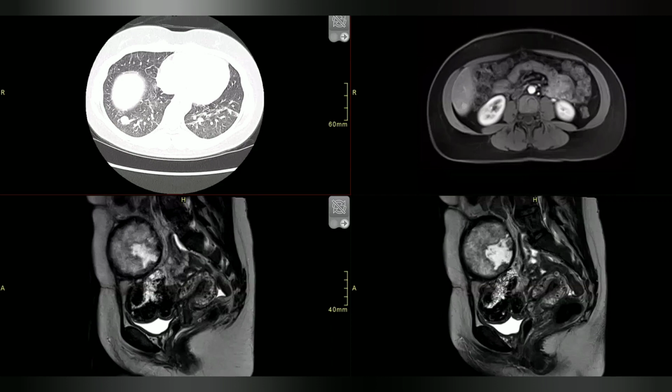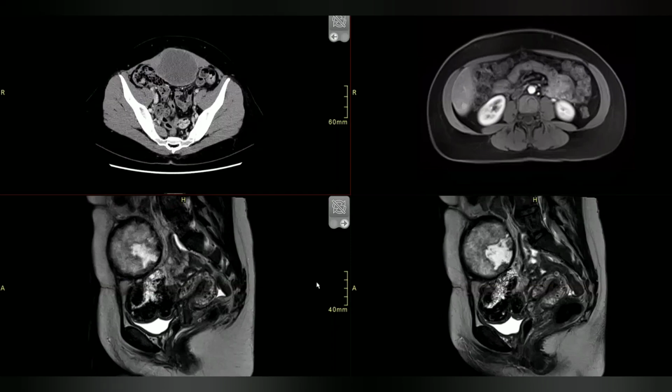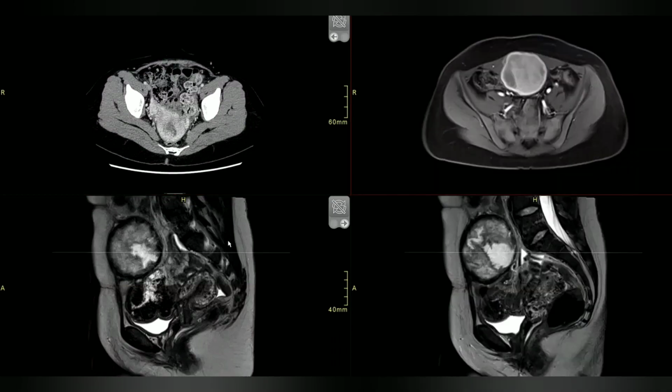So this is a CT also for her. Okay. So what are you thinking? What is your thought process here? What are the possibilities? Okay, let me put it another way. What conditions are associated with pregnancy? Like she could have post-operative complications. That's number one. Number two, this thing apparently does not look like a hematoma, right? So what other things would you be thinking of that could go wrong in a pregnancy? Are there any neoplastic conditions associated with the pregnancy?